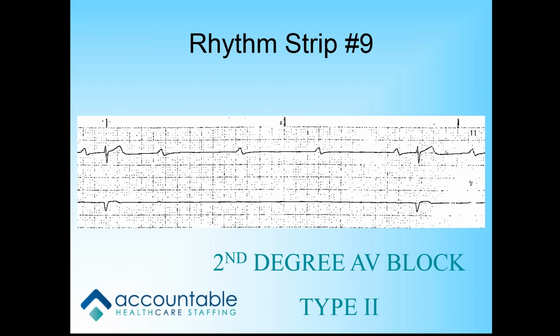Yeah, I don't know. I'd say second degree. There you go. I was going to say second degree because it doesn't fit 1 or 3. Exactly. Perfect. It doesn't fit 1 or 3. This is type 2, Mobitz type 2. So it's second degree AV block type 2.